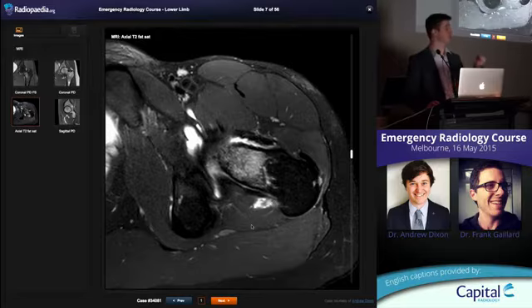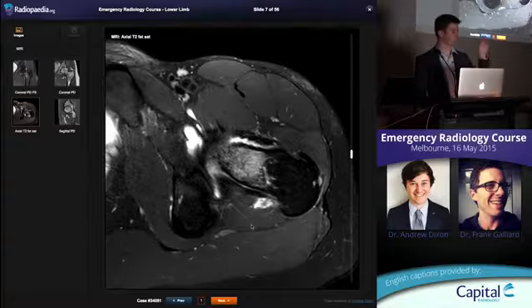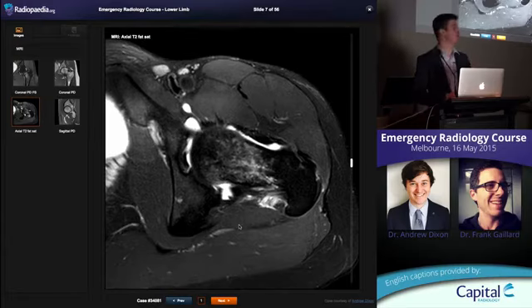All right? So just remember that the blood supply to the femoral head comes from way down at the base of the neck. And stress fracture in a runner, classically on that inner aspect, medial aspect. And I think this also just emphasises the importance of if you've got a patient who you suspect has a femoral neck fracture, can't see it on an X-ray, MRI is a great test. You're going to see very florid edema around the fracture and know that there's a significant injury there and be able to manage it appropriately.